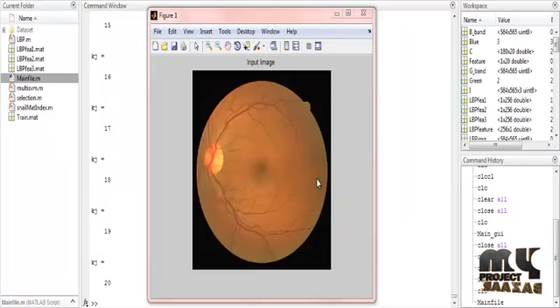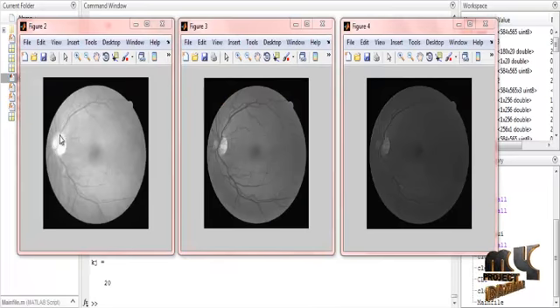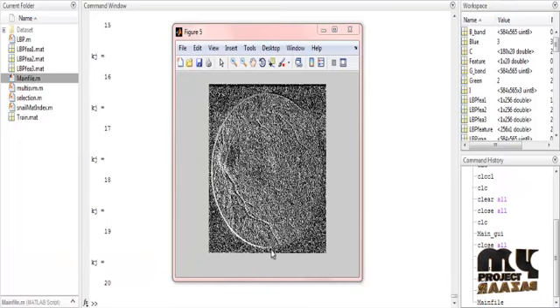This is the first image, called a TIFF image. This is the input image of the process. In the next figures, this is the second image, third image, fourth image. These are the channel separation of RGB: red channel, green channel and blue channel. These are the 3 channel separations from the pre-processing step. In this image, the histogram equalization technique is applied, to check whether the fundus image is affected or not. This is the figure of the process.